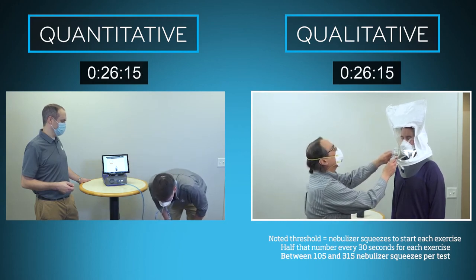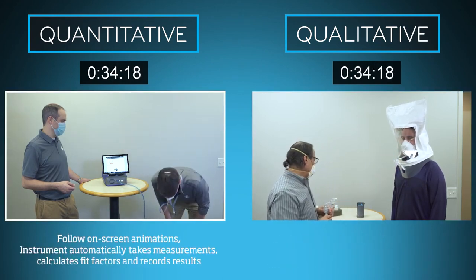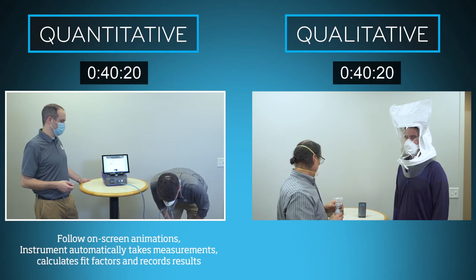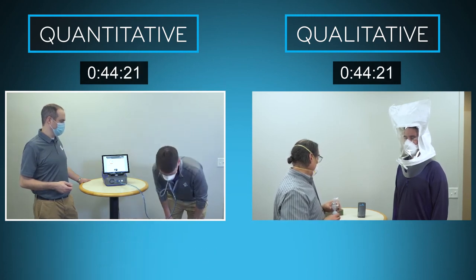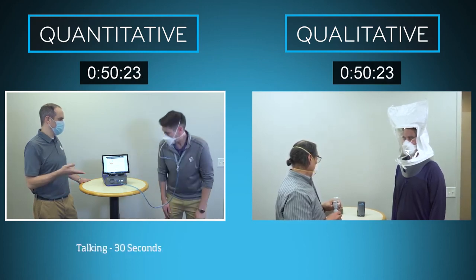This results in between 105 and 315 nebulizer squeezes per test. For the quantitative test, the respirator wearer simply follows the on-screen animations to complete the exercise. The instrument automatically takes measurements, calculates a fit factor for each exercise, and records the results. As the first exercise for the quantitative method is shorter, the second exercise of talking for 30 seconds now begins.